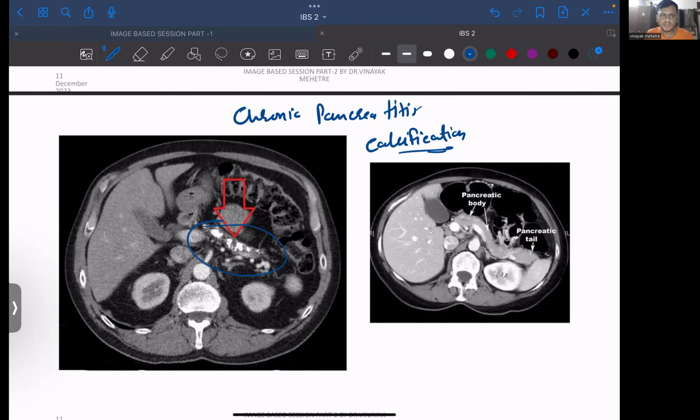ठीक है, एक्यूट में क्या मिलेगा, कोलन कट ऑफ साइन और गैसलेस एब्डोमेन. ओके, गैसलेस एब्डोमेन विथ डिस्कलरेशन ऑन एब्डोमेन, राइट. कूलन साइन, ग्रे टर्नर साइन, दैट मींस डिस्कलरेशन है वहां पर एब्डोमेन पे.